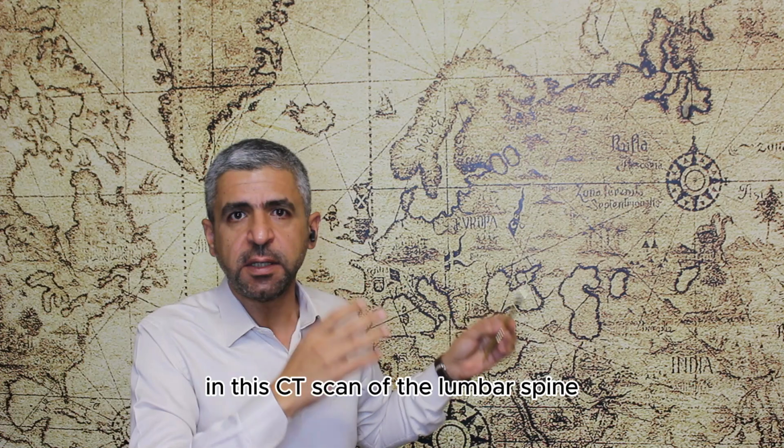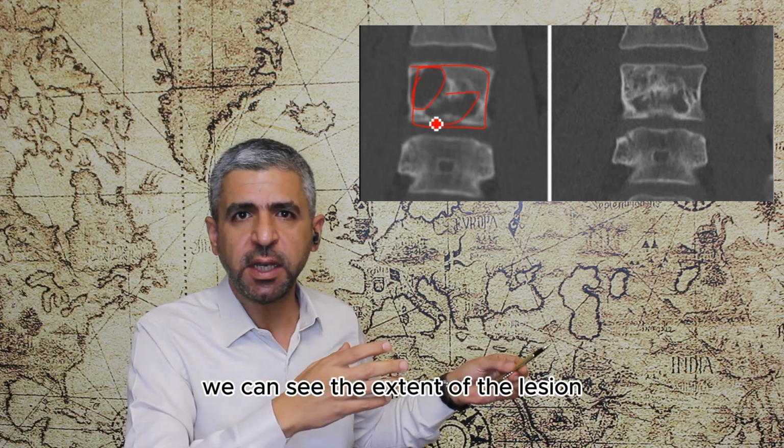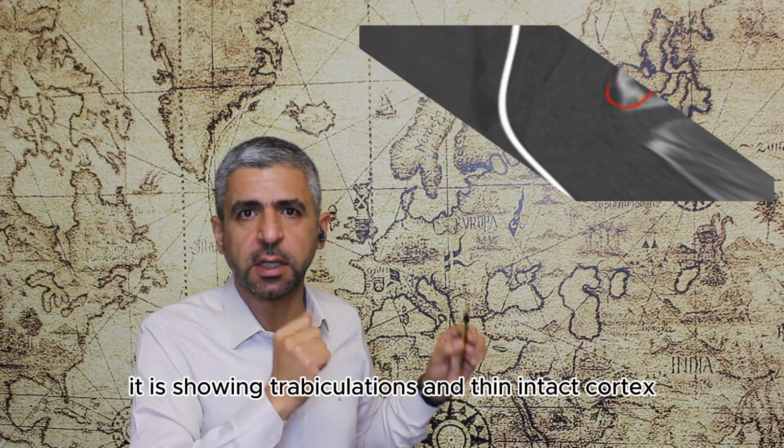Another example in this CT scan of the lumbar spine showing aneurysmal bone cyst within the vertebral body, we can see the extent of the lesion and the absence of soft tissue involvement. It is showing trabeculations and thin intact cortex.